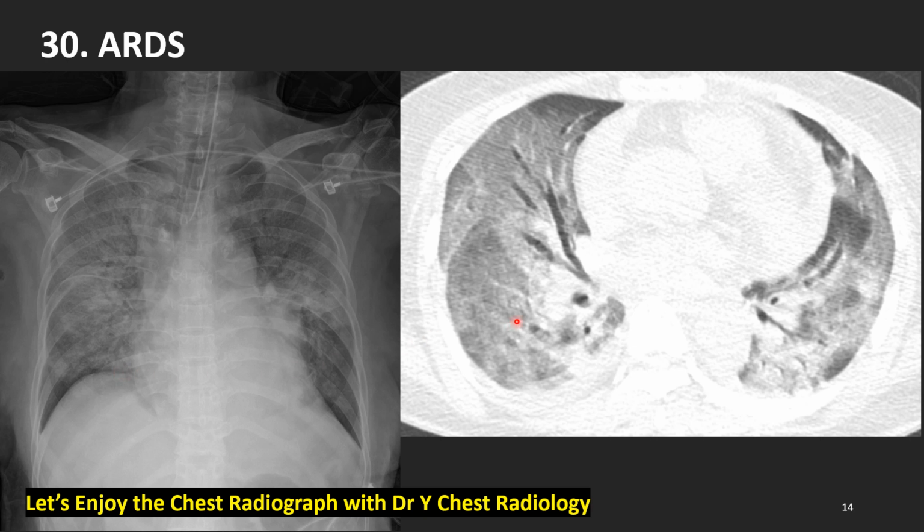How about the CT? Yes. Heart is a little enlarged with pericardial effusion, diffuse bilateral GGO with air bronchogram with irregular dilatation showing features of traction bronchiectasis with minimal small pleural effusion. This is compatible with ARDS. This AP supine film of lung pathology shows exactly the same as CT or maybe a PA erect film.